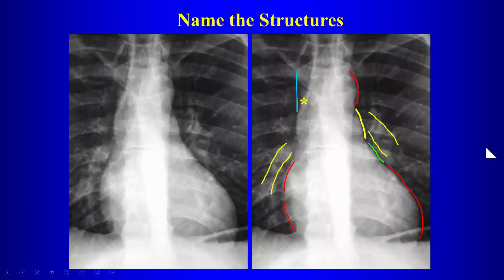So starting with the mediastinal anatomy, the border-forming structures of the mediastinum, as we go around, what is this over here? SVC. That's the superior vena cava. Over here we have the right atrium, right? This over here is the interlobar, that's the interlobar pulmonary artery, okay? And on the left side, this is the left interlobar pulmonary artery.